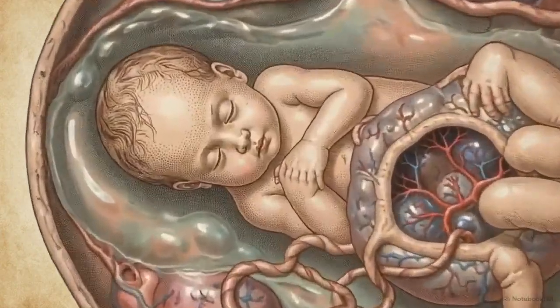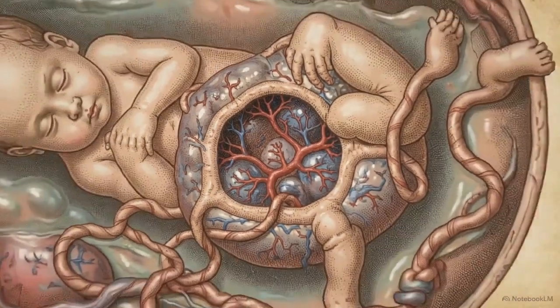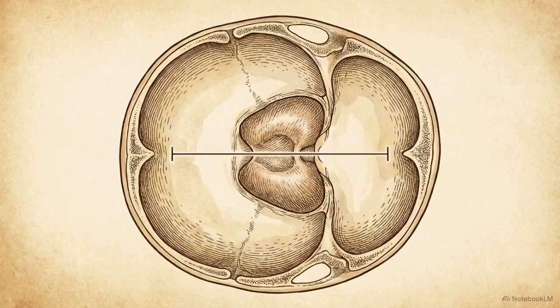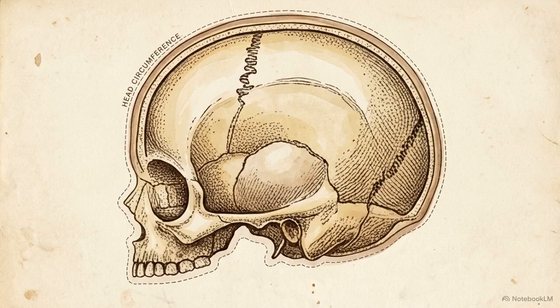Establishing the clinical baseline for fetal growth in the second and third trimesters relies on 4 highly specific ultrasound measurements. This diagram shows the required cranial metrics. The biparietal diameter is measured across the thalamus, starting from the outermost edge of the near skull and ending precisely at the inner table of the far skull, deliberately excluding the outer boundary.